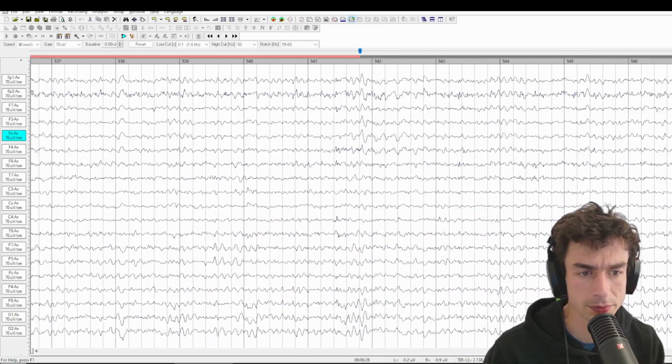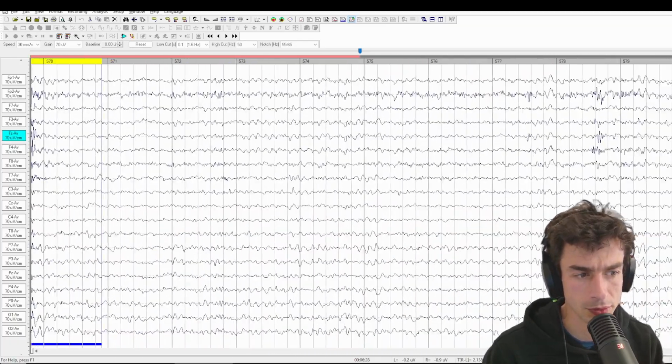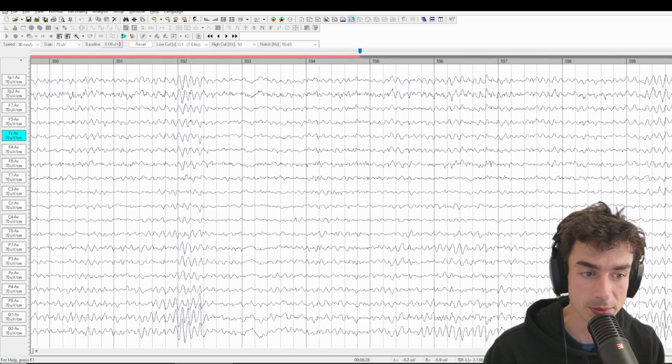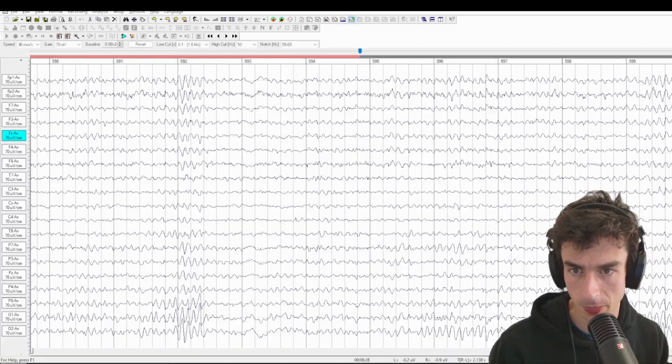Okay, well, if we don't, we don't. And it didn't happen all that frequently. And we wouldn't be surprised to see beta spindles when there's this much difficulty in vigilance regulation. Let's grab this last alpha squeak.